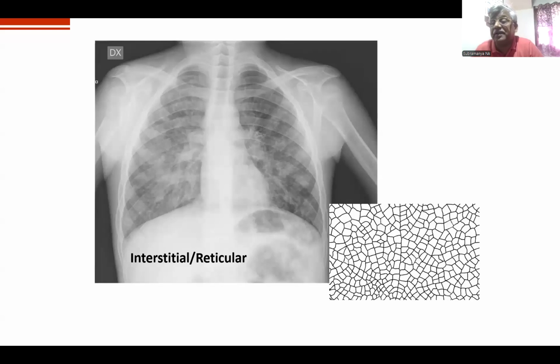That means the alveoli is patent, the airway is patent. That means the air in the airway gives double contrast. These densities appear more dense because there is a contrast of the air. That means like barium. Instead of pushing barium, here you push air into the lungs so that the interstitium appears better. Did you understand? It's actually pseudo air trapping that happens in interstitial diseases. The air is perfectly going in and coming out, and the air inside gives a double contrast.